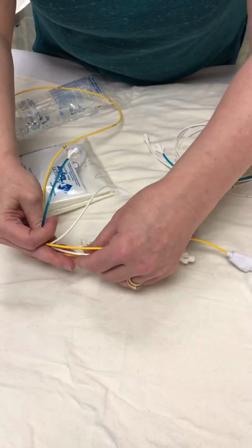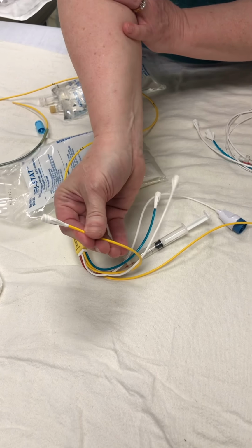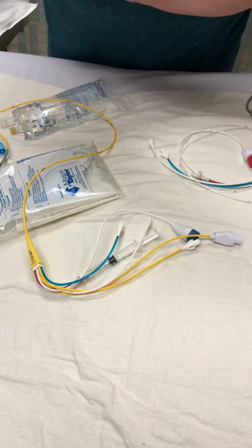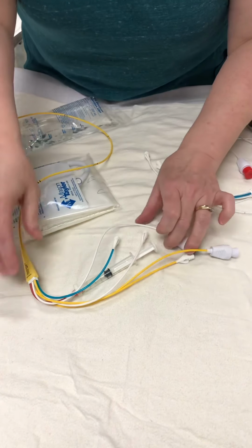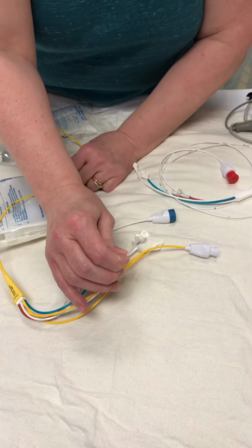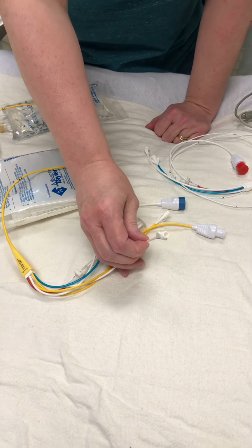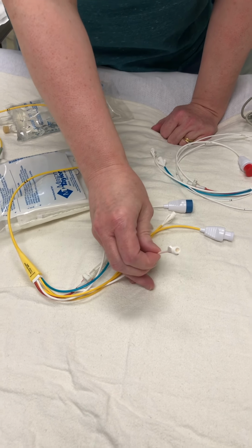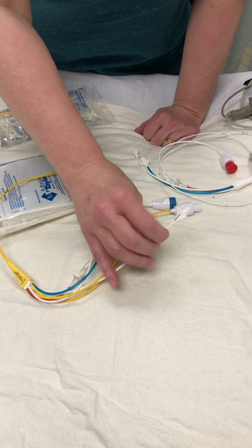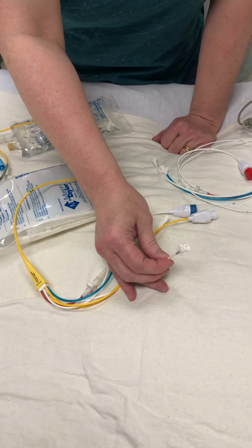The next port I'm going to talk about is your PA distal. And this is where your monitoring port is. And this is what you're going to see yellow on the monitor, and I'll go through that a little bit later. This is your proximal infusion port. This is a port that we will put any vasoactive medications in, your inotropes, your vasopressors in the open heart patient. If you don't have any of those, you do want to just have a TKO line just to keep the vein open.